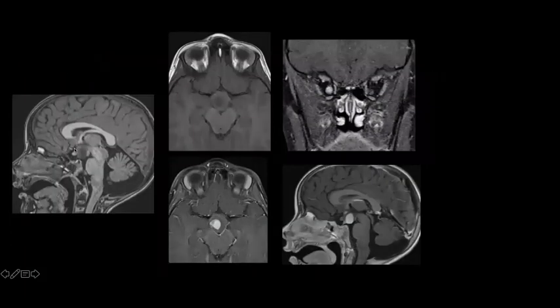And you get the astrocytoma, which is most commonly a pilocytic astrocytoma. So it can happen anywhere along the optic pathway. So you have here the hypothalamic region, but then you get some starting from the optic nerve in this patient, and it gets some heterogeneous enhancement.